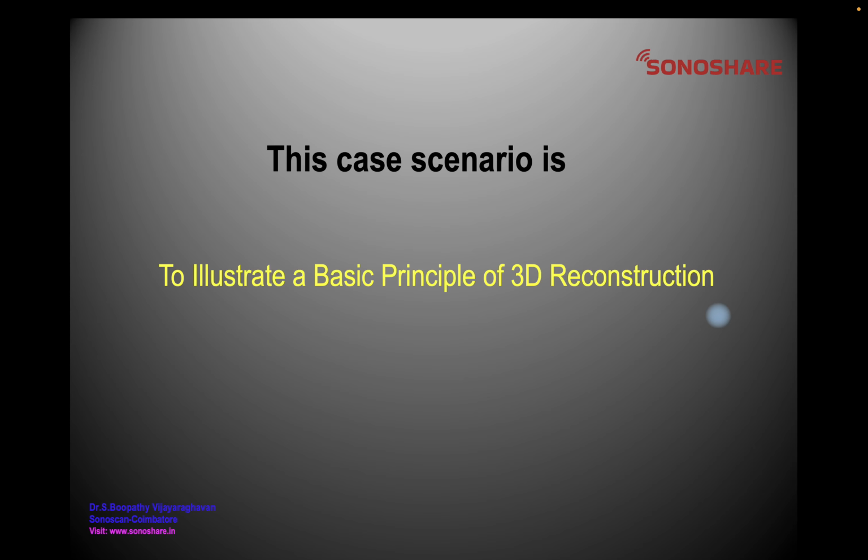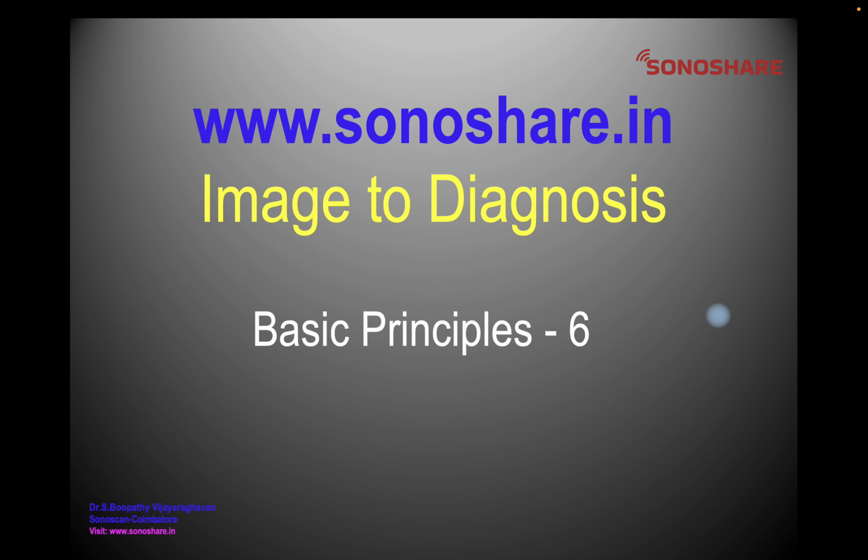This case scenario is to illustrate a basic principle of 3D reconstruction. If you would like to see the workup and explanation of the reason for echopoor ribs, please log on to sonoshare.in and go to image to diagnosis basic principles 6 in the series.